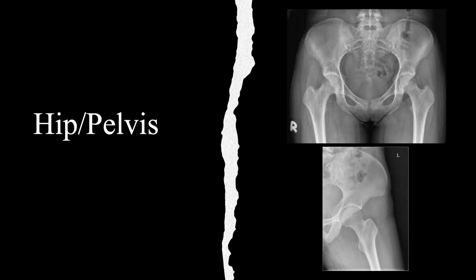So again, oblique view, more lateral, kind of a different view, but you want to look for the same things. Start up above, find all of your foramen, all of the rings, look at the pelvis here as a whole, the SI joint. You don't have one to compare it to on this side, however. Then I start going down to the acetabula, femoral head, the neck, greater trochanter, lesser trochanter, subtrochanteric, and then the shaft of the femur. So again, systematically.